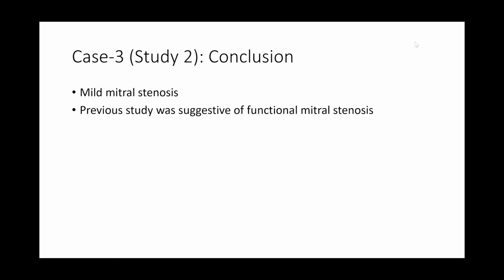Michelle, what's your threshold then in cases like that to proceed with the TOE to have a better look at the mitral valve and actually have a look at the opening of the valve? Yeah, the planimetry is the most important finding because it's not dependent on all these things. But whether I would do the TOE just to calculate planimetry depends on the clinical context.